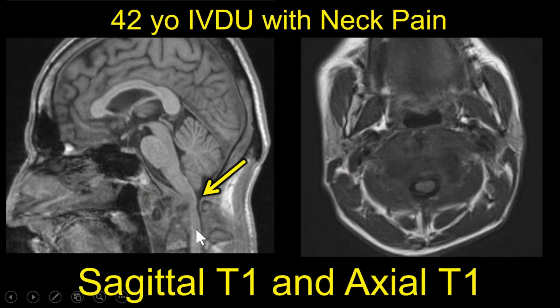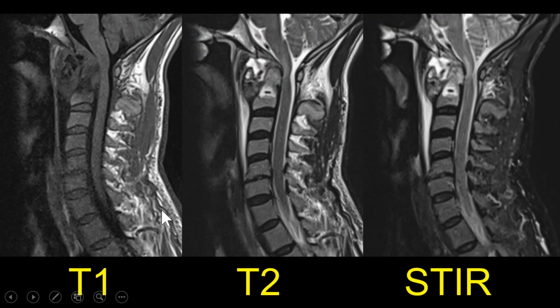Here's another patient who came in with very bad neck pain. So here's a sagittal T1, nose is dark, so this is T1 before contrast. And we see a lot of soft tissue here around where the dens should be. We don't see normal anatomy. It's all very dark here on the T1 image before we give contrast. And here's some MR images.